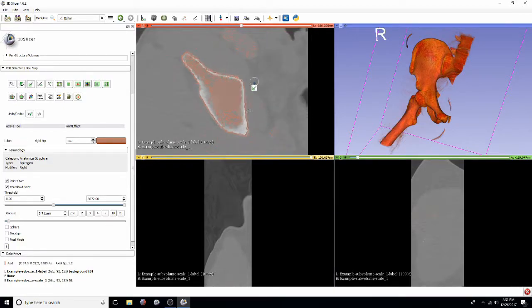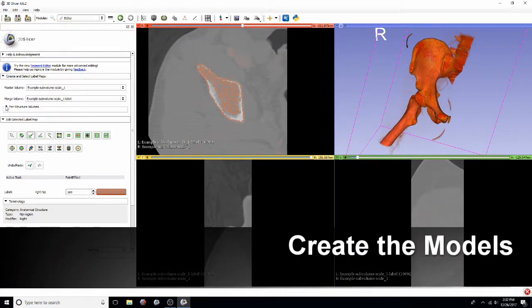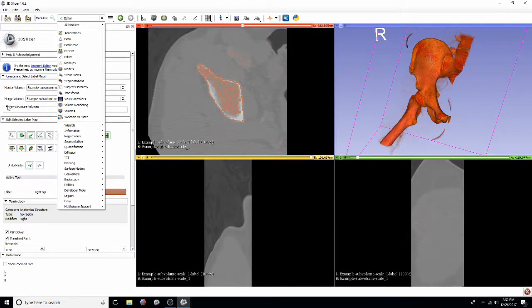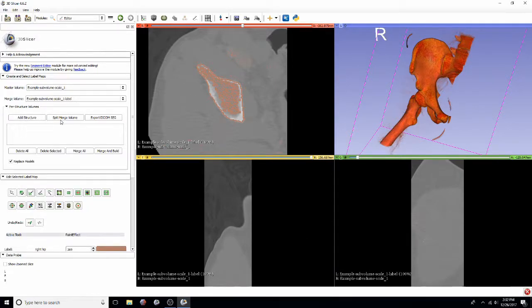Obviously, it would be a better model and even print a little bit quicker if you don't have really complex anatomy like that on the very inside of the bone. However, it also takes a lot more time to segment out, so it's kind of balancing the two.